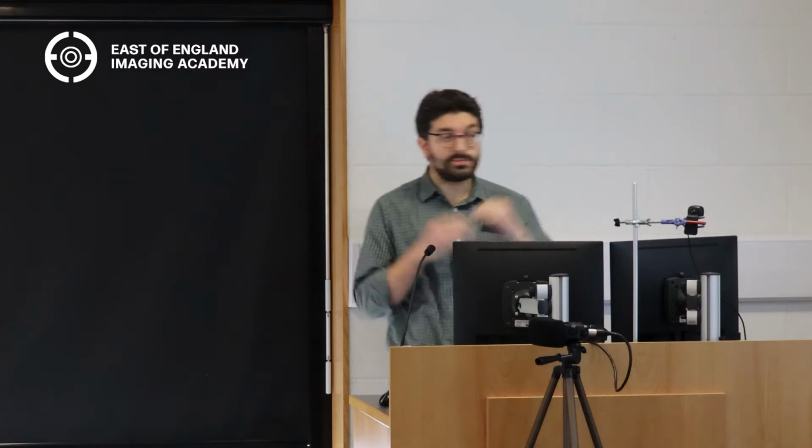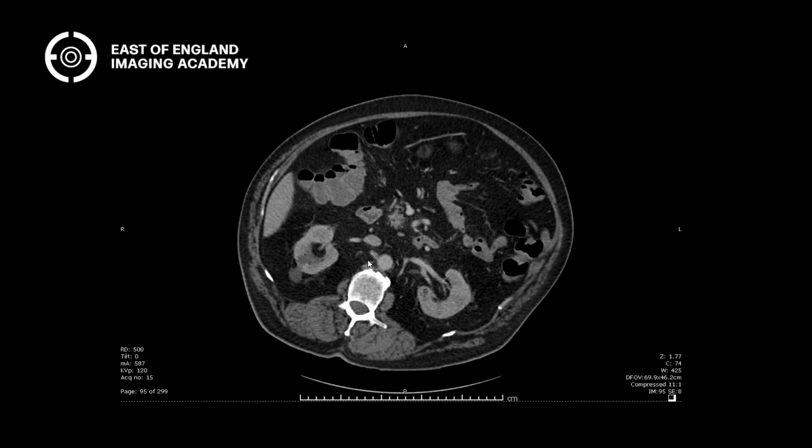Angiomyolipoma, yes, that's right. So you can begin to see how just by understanding the very basic concepts, you can begin to actually do differential diagnosis and actually do radiology. Yeah, CT in particular is not that difficult to grasp. So once you've understood the concepts of Hounsfield units and the different tissue ranges of Hounsfield units, you can get started. The next thing to understand is about windowing.